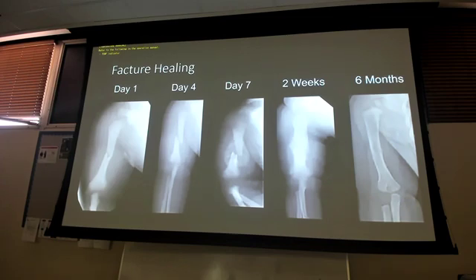So how are you establishing whether or not that line, at your level, what I'm trying to teach you, whether or not that joint line is a fracture or is actually just normal because that growth plate hasn't fused yet? I'm not going to make you memorize all that, except for Salter-Harris fractures, and we'll talk about those because they make a big difference, as they need surgery to fix to prevent growth delays. But that's one of the only pediatric ones I'm really going to focus on a lot. But this just goes to show you the bone healing process.